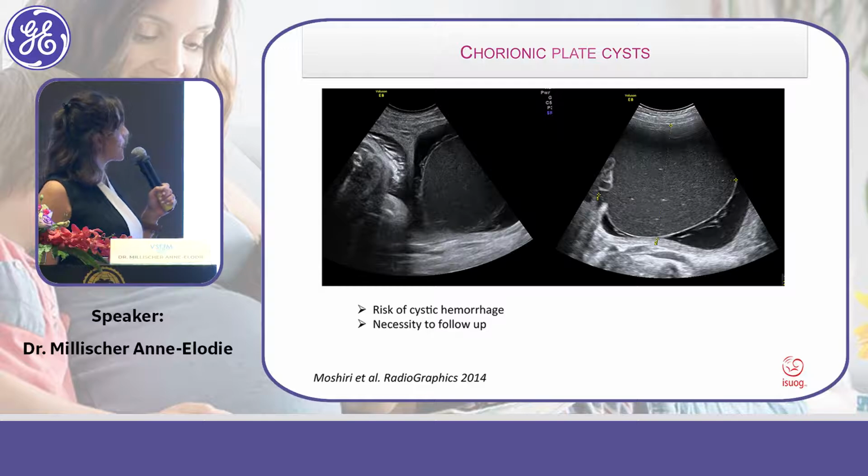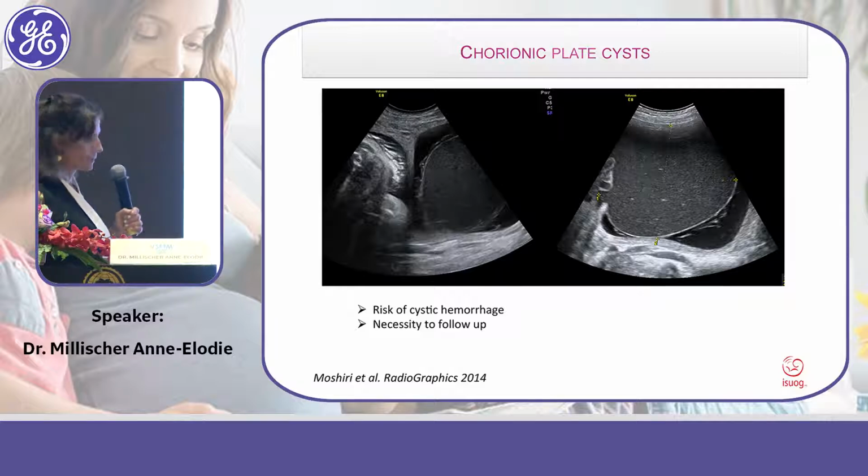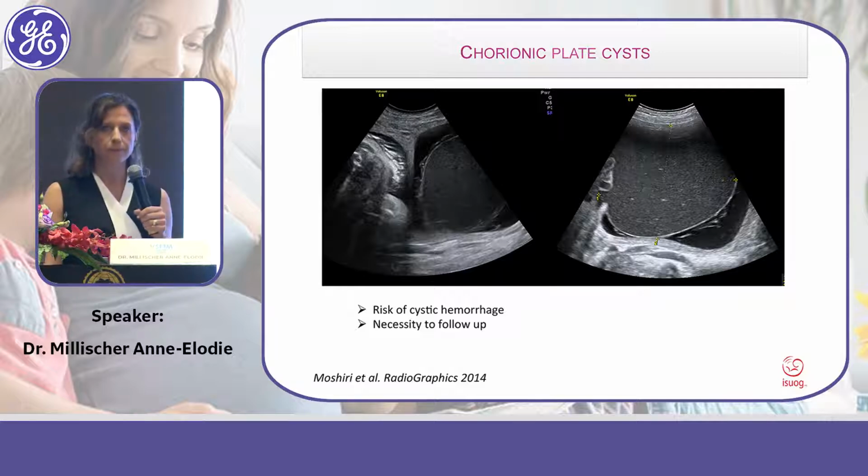Sometimes it occurs like that, very impressive cyst due to the hemorrhage inside the cyst. Đôi khi các bạn sẽ thấy những cái nang rất là lớn và nó có những cái phản âm lợn cợn bên trong, thì đây là do có xuất huyết ở bên trong nang.